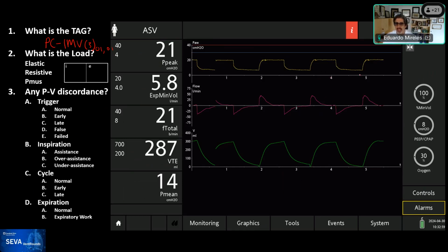You probably would say S, but because you're able to see the settings over here on this side, and you can see the mode, then you are able to know that this is IMV type 3. It's type 3 because the spontaneous breath, the presence of our achieving the minute ventilation that we have set, which is over here, the 100%, will suppress the mandatory breaths. And I'll show you an image of how that looks.